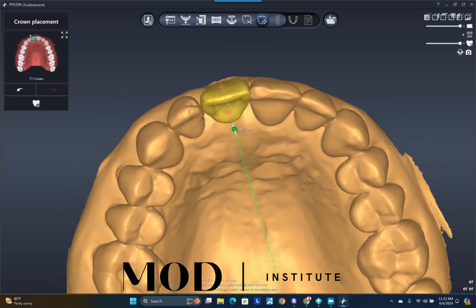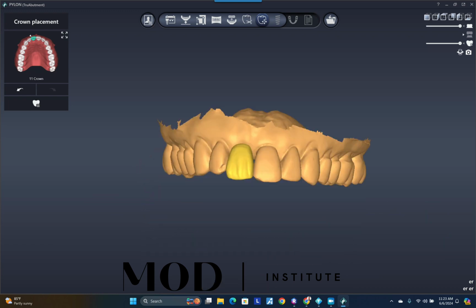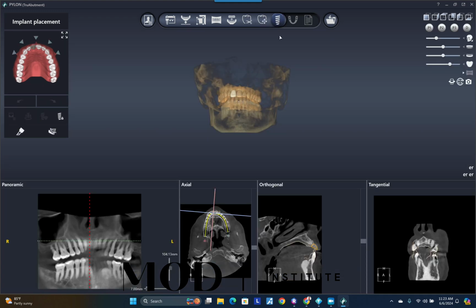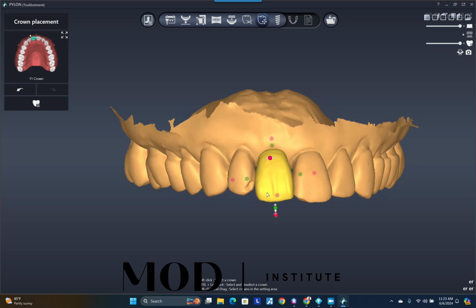And you could see using the compass is very intuitive. If you click the green areas, you could stretch and morph. If you click the red, you're rotating. And so once you have your tooth waxed up, you are now going to go ahead and start the design process for your actual surgical guide.